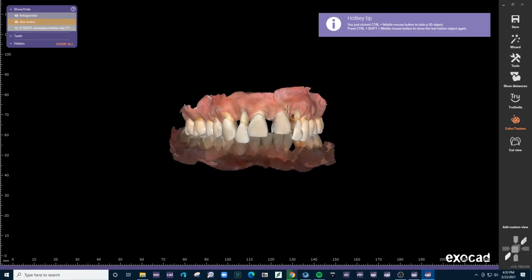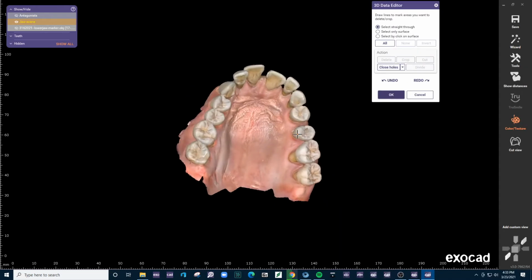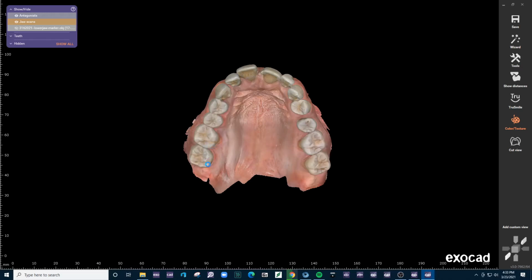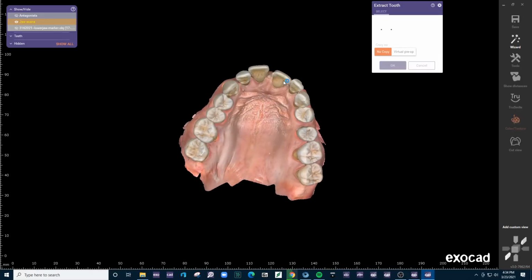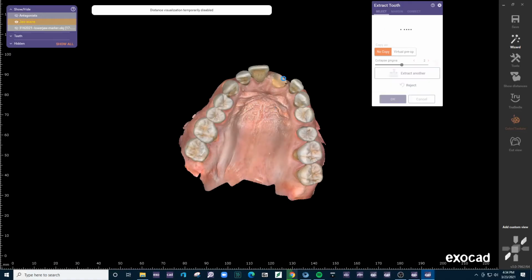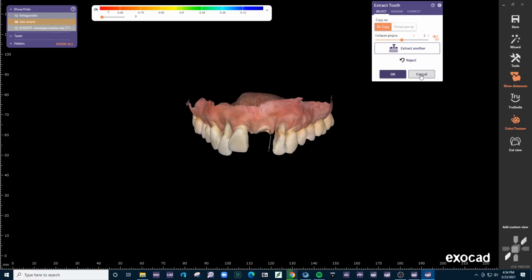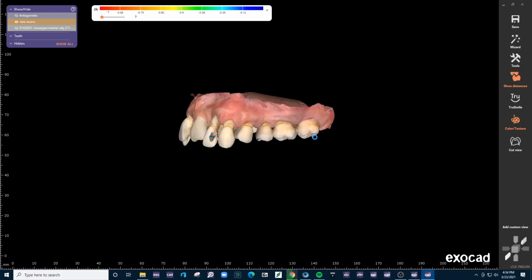All right, cool. So what we're going to do is start out with the extractions. I think in this case, using the extraction tool, which is quite nice by the way, would be pointless because it's going to be an immediate denture. It looks like there are some periodontally involved teeth. Normally I would use the new extraction module, but I think just editing this mesh and performing some sort of bone extraction is going to be the wiser of the two options. It's going to be a little faster for us to do that, just because we have so many extractions to do.